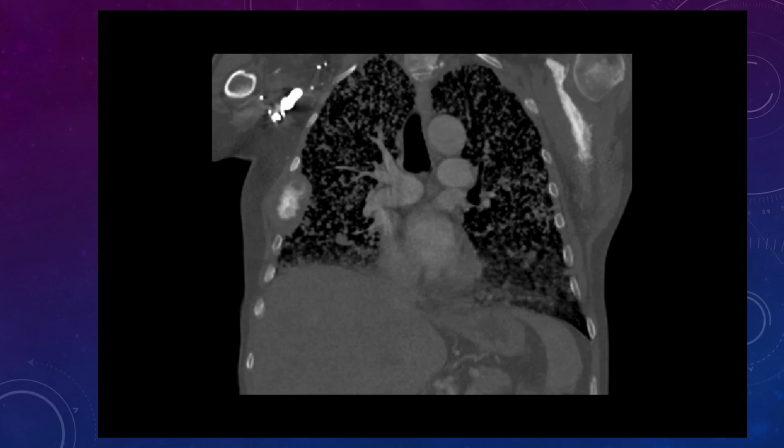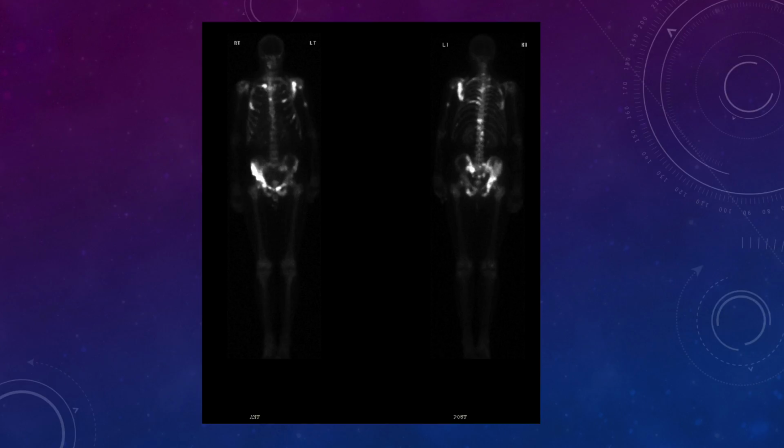They stuck them in the bone scanner, and there you have your answer. So we've got all the sites indicated that we were looking at, and then we've got this right hemipelvic lesion as well, very hot on bone scan. That all started with the plain film of the shoulder, and you follow them through with the findings that you get, okay?